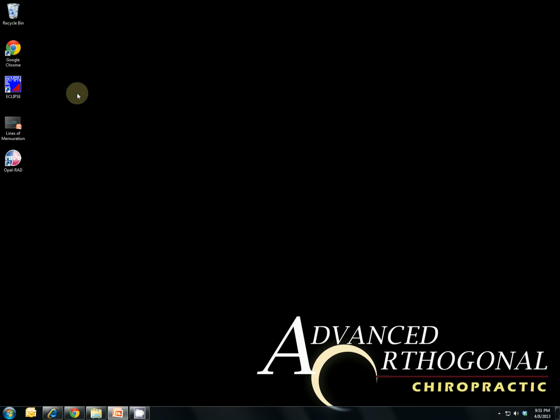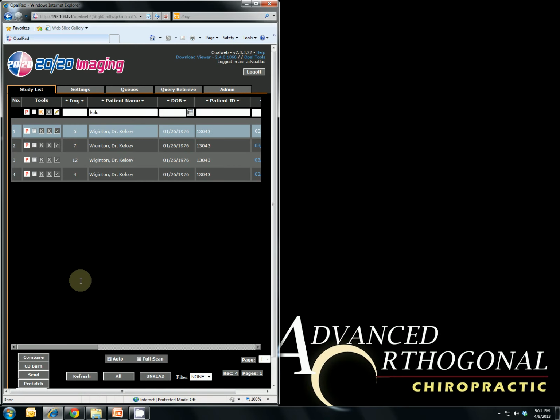Okay, I'm going to go over how to set up your user in Opal Rad. This is just an intro. You don't have to watch this if you don't want for the class, but it definitely is something to watch if you're new to Opal Rad.